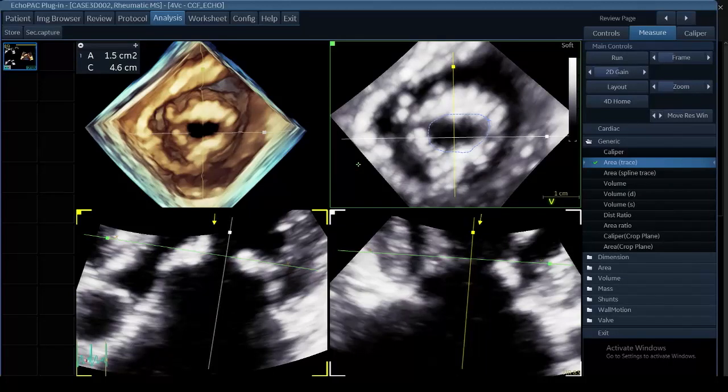Serge, do you want to actually go ahead and do this one next? That way we'll trade off. And just show them how to exit out of that, yeah.